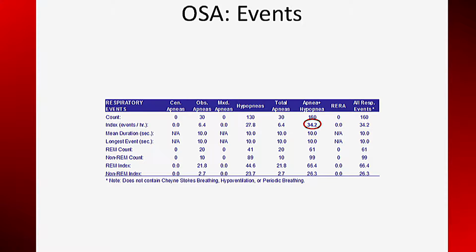The apnea-hypopnea index was 34.2. This is well above Medicare guidelines for CPAP therapy. This patient will qualify for CPAP testing and treatment.